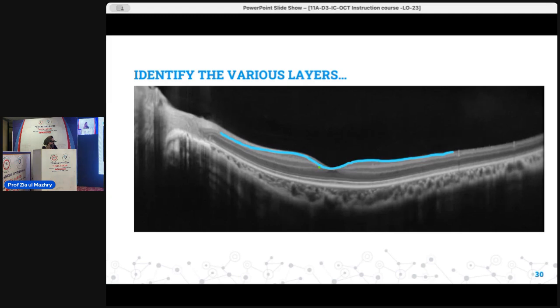Yes, this is the outer nuclear layer. And please, can anyone name the four hyperreflective bands that I told? Retinal pigment epithelium. Yes, the outermost is the retinal pigment epithelium. Ganglion cell layer. The ganglion cell layer is right here. This one. The duller band. So we will continue this quiz section at the last of it.